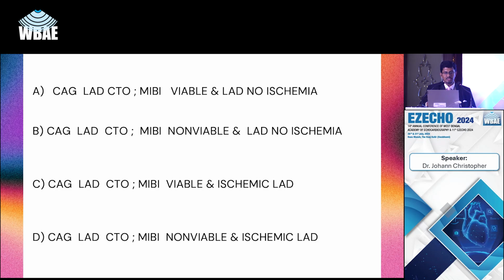And the last question may be tough for those of you who have not seen, but this is really easy because there is a perfusion defect exactly in the same area of LAD. All the other areas are good, yellow is good, and this area which I showed just normalizes in the rest. And that really means only one thing, that there is a large amount of ischemia. And this picture is also very telltale. Dark image and completely becomes normal.